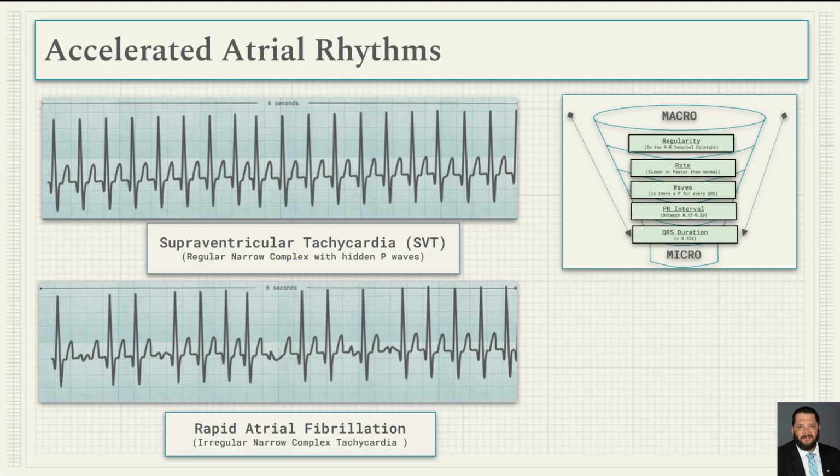The other version of that is what we would call supraventricular tachycardia, which is a rate high enough that you can no longer discern whether or not there are P waves present. And the reason we don't use the term sinus tach for this is that we cannot determine if the rhythm originates from the SA node or other areas above the junction. The most commonly used rate is around 150 to 155 beats per minute. We'll call SVT. But as far as the textbook definition goes, we cannot discern a rate.